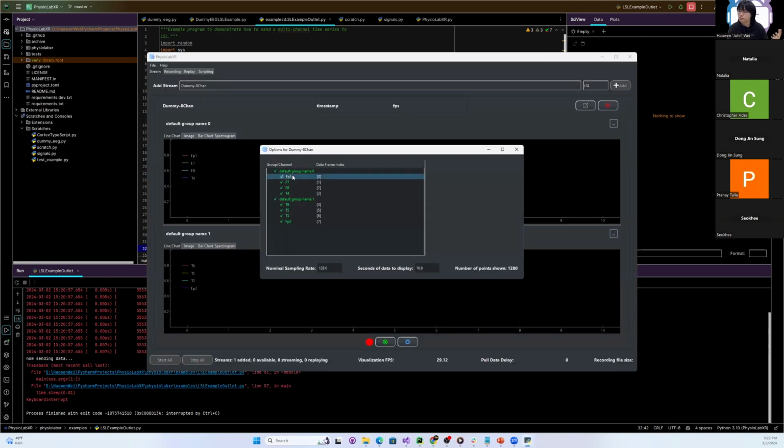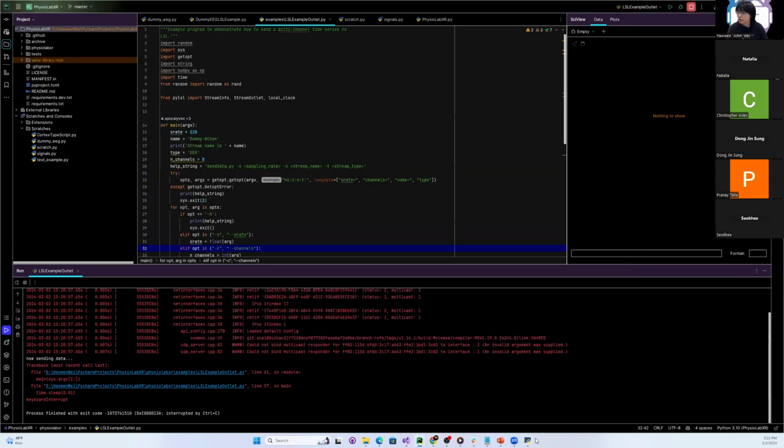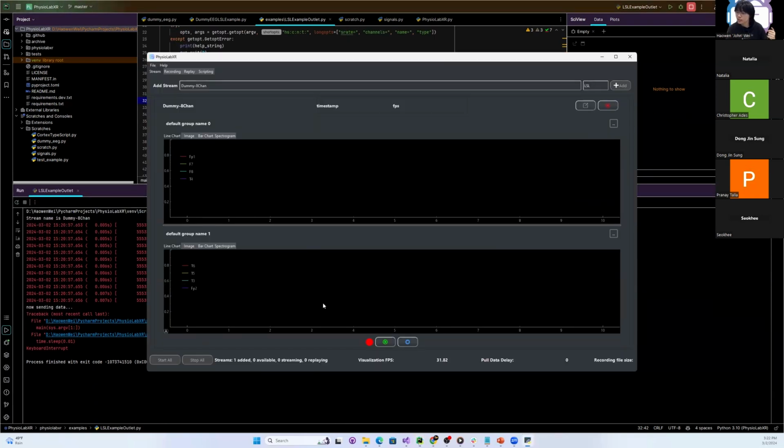Perfect. Because I added the stream with the same name before, and I did some format changes here, that's why it looks a little bit different. We will talk about how to group and organize your streams in the next few slides. Right, so at this point, I can start the stream.